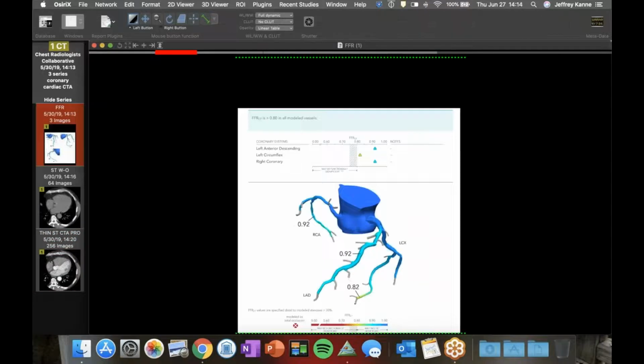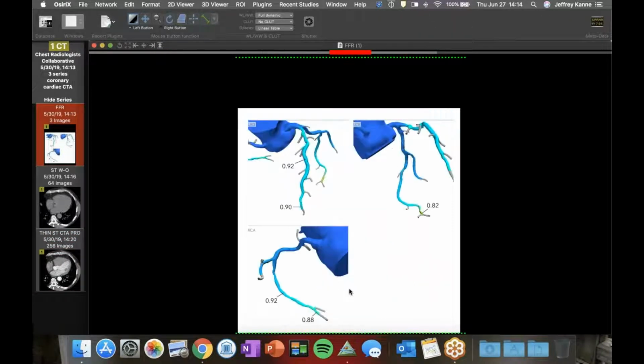It just normally decreases as you get distally. I've had cardiologists looking at it saying, oh, this is positive because it's 0.7 at the distal vessel, but there's no stenosis. And you're like, that's not how you read them. It's the gradient across the stenosis. Anyways, there are papers on that.